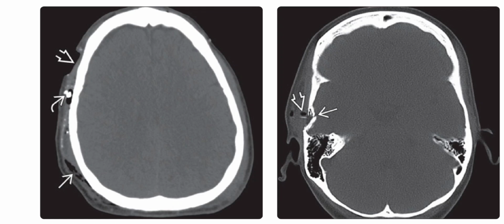Left is the axial non-enhanced CT scan in a patient with head trauma while bicycling on a gravel road without a helmet, and it is showing a lacerated avulsed scalp, extensive subcutaneous air, and multiple hyperdense foreign bodies. That is, it's a road rash. This is called road rash.